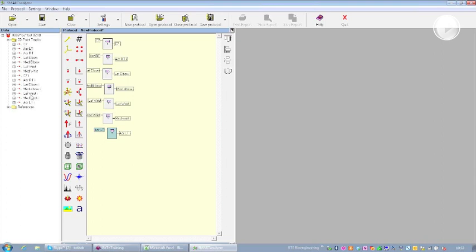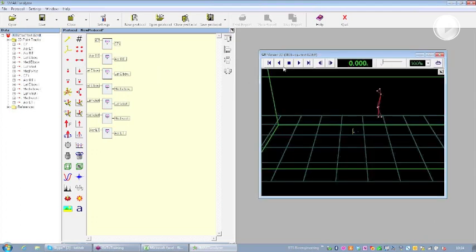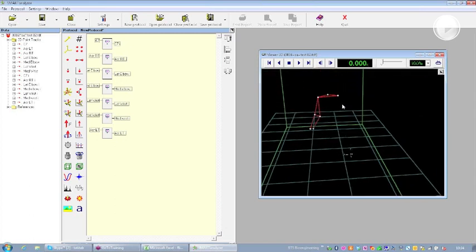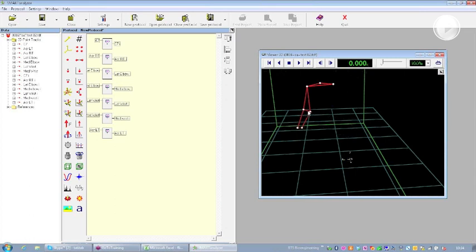Okay? Then we are going to see how to create a 1D angle of the flexion extension of the elbow. So basically, I'm going to use, let me show you the viewer, the acromion, the medial point between those two condyles of the elbow, and the medial point of the wrist, in order to define the 1D angle of the flexion extension.